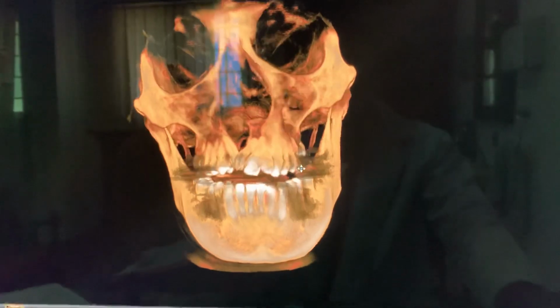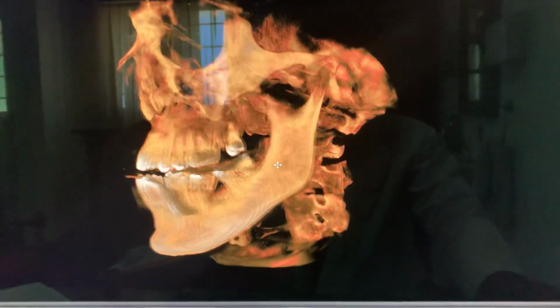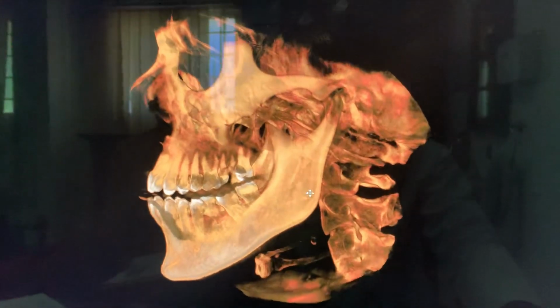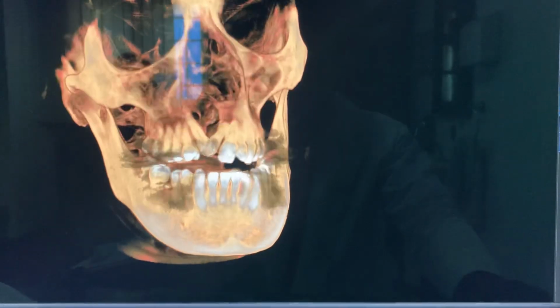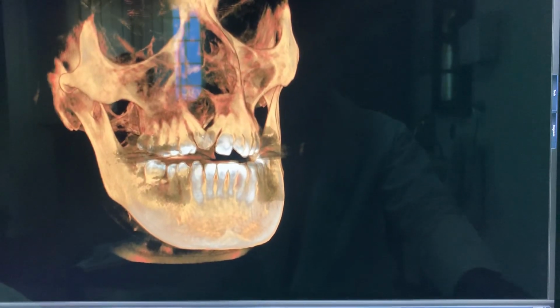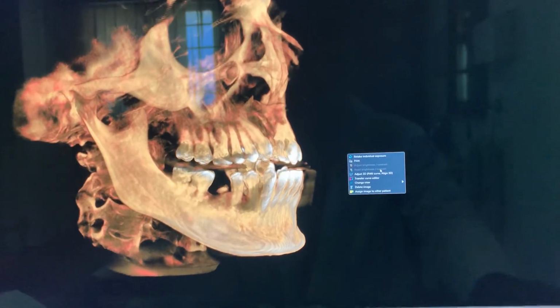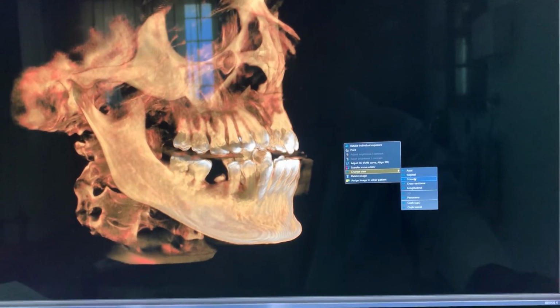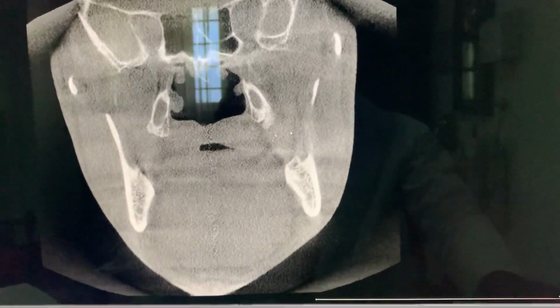He's had 4 surgeries done before, but you can see he has a lot of issues with his upper jaw. There's less growth, so we're going to address that with distraction. He has some root stumps, we're going to take care of that. This is the cleft alveolus, it's still large and wide, which I also showed you the other view. Now I'm going to go to the coronal view and look more at what we need to do in the nose.